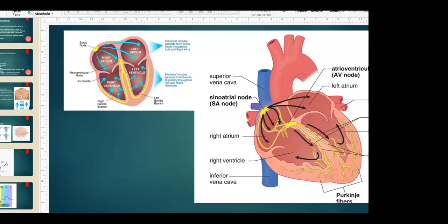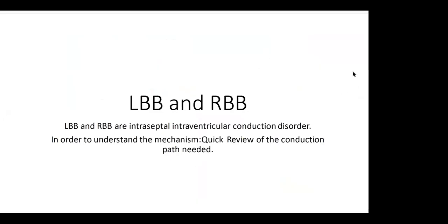So once you have one ECG that is pathological, it's always important to monitor the patients. You always tell them to come back for control checkups just to see if it progresses or if it disappears on its own, because it's also possible for the blocks to just disappear like that. Okay, we can move to the next one.